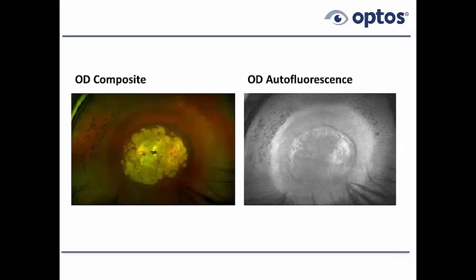Again, some additional information suggesting that this zone over here may actually mean that this is still stretching. This could be some activity. This patient is a 34 diopter myope. Perhaps they're going to actually turn out to be closer to a 40 diopter myope. Axial length, if I remember, was 35 millimeters.